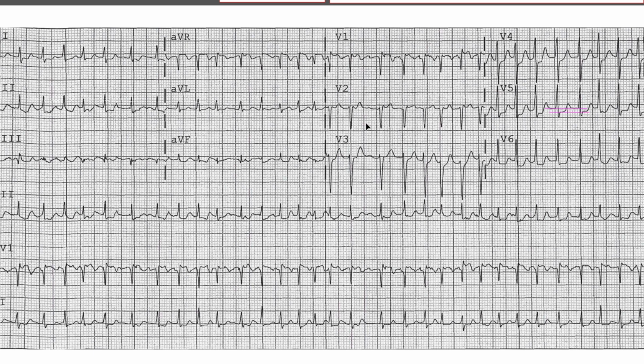And you have to start looking for perhaps reciprocal changes in other leads to see if there's any ST elevation somewhere. Or you're going to have to continuously monitor this patient and see if this ST depression eventually starts turning into ST elevation. Okay, so this fast heart rate becomes almost irrelevant compared to the findings you see in V4, V5, and V6. That's the big red flag in this ECG.